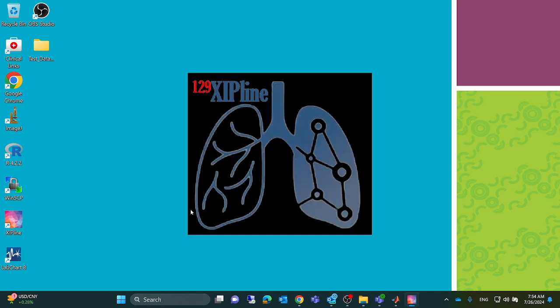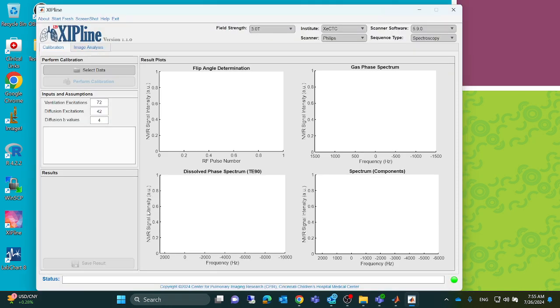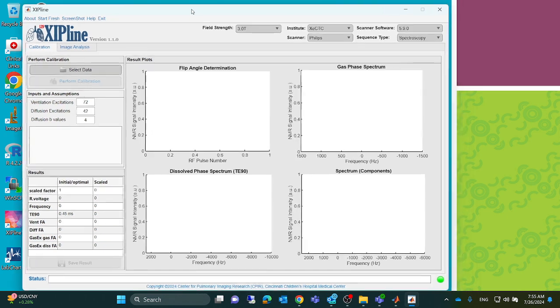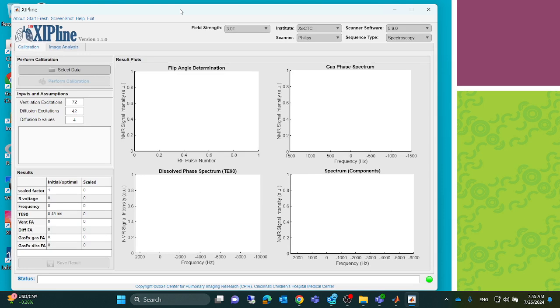In the last couple of videos, I showed you how to perform the calibration, ventilation, diffusion, and gas exchange analysis using the compiled application, which means you don't need MATLAB to run this application. It will only use the MATLAB runtime, just like the Java or C++ runtimes that we use on a daily basis. So this application is compiled, so that means you cannot edit it. You have to use this as it is.